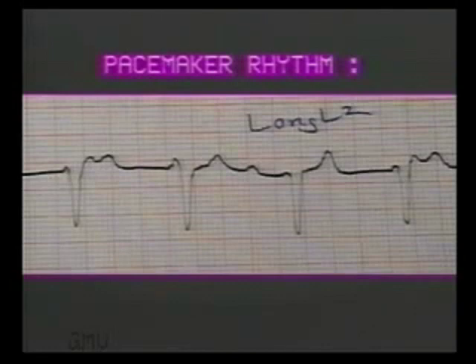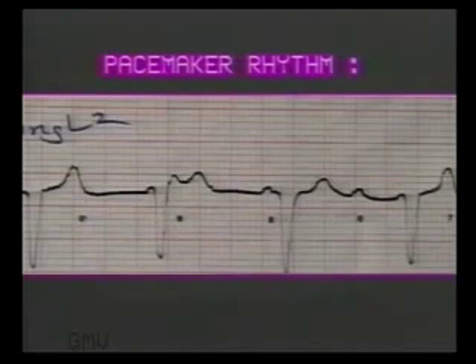Note the wide QRS complexes occurring very regularly at a rate of 75 per minute. This is a pacemaker rhythm. Since the pacemaker is placed in the ventricles, the QRS complex is wide, like a ventricular beat. Now note the P waves. P waves are seen at regular intervals and bear no relation to the pacemaker rhythm. The condition is complete heart block on pacemaker. We will be studying the heart blocks in the next chapter.